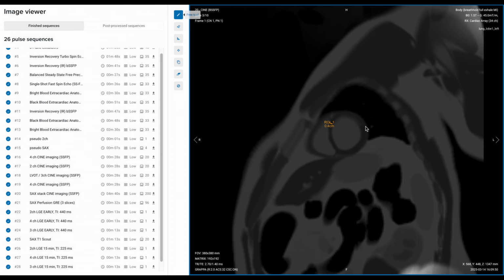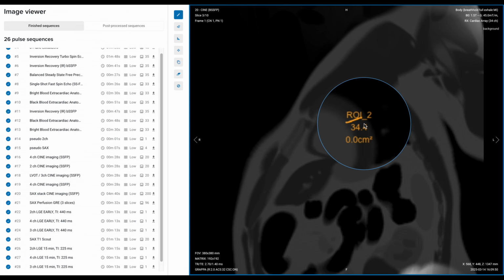But if the enhancement extends all the way to the epicardium, like in this more severe case, we call that transmural late gadolinium enhancement. This pattern suggests non-viable infarcted tissue. So this means almost all the affected myocardium has turned fibrotic or has a scar.